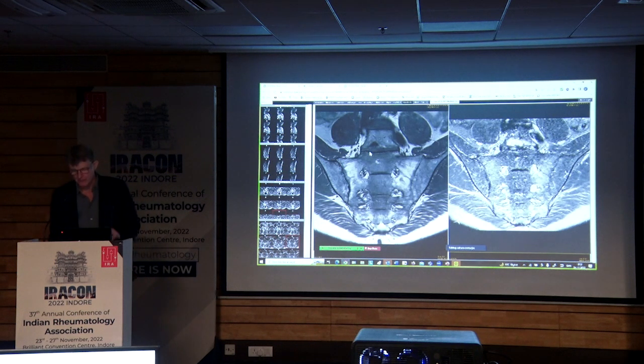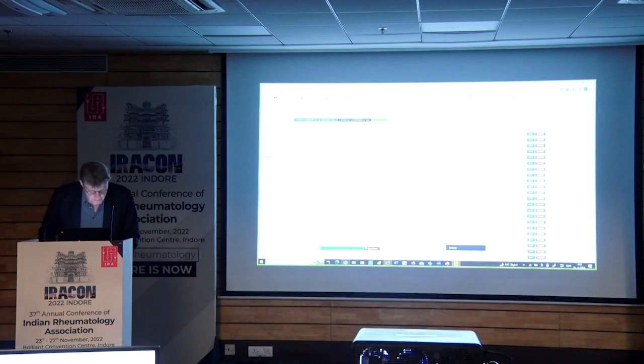Right, then I think we should move on to another case, and then we should take B1. So case sacroiliac joint B1. It's a little bit down here. There are 9, 7 or 8. Then you click that.